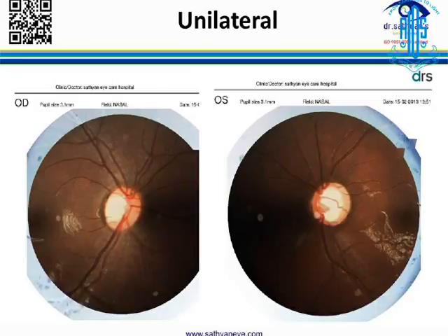And you can see that this is a small boy about 7 years old. This is essentially normal. You can see the disc is a little larger, but almost the same disc size. But you see this cup is definitely larger than this cup. And you see this vessel. I just want you to focus on this particular vessel. You can see the cupping is here.